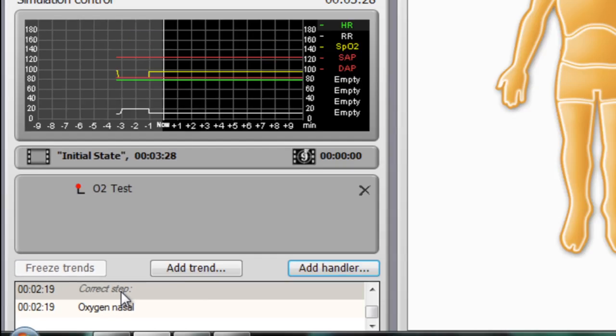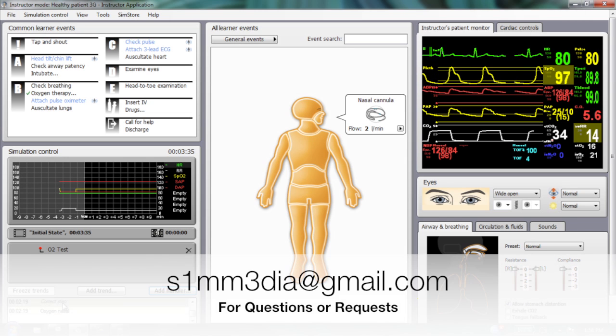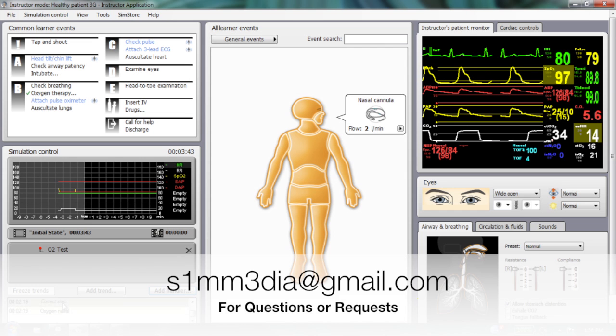In the Advanced Handlers video, I will show you how to program a handler into a scenario, how to add a trend as an action, making the patient response more gradual, and a few other tricks. I hope this gets you started programming your own handlers so you can spend more time paying attention to the learner in simulation and less time looking at the computer.